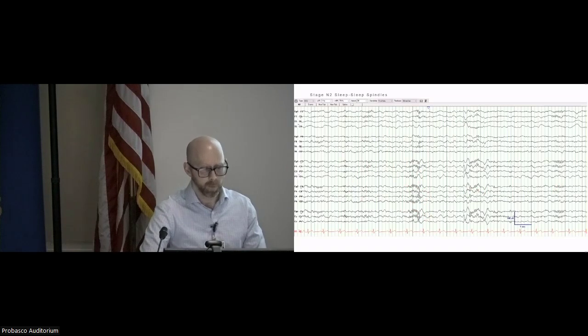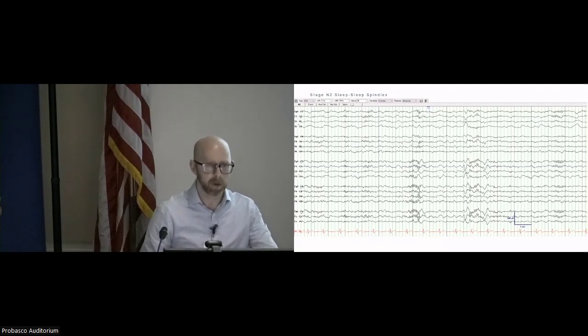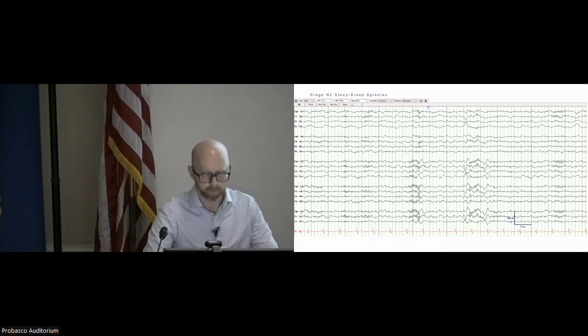And it's really nice when you get EEGs that do have this stage of sleep, because then we know we've gotten a great look for epileptiform abnormalities. So if you have an outpatient study and you get to this stage of sleep, that's really reassuring. It doesn't mean that they can't have epilepsy, of course not, but it's a much better EEG, much more likely to see something if you get sleep than one that's just awake.